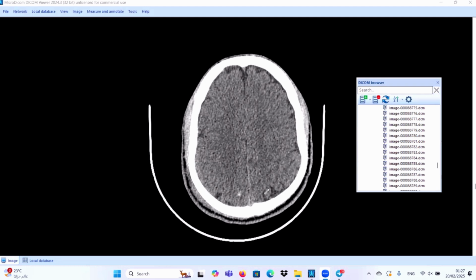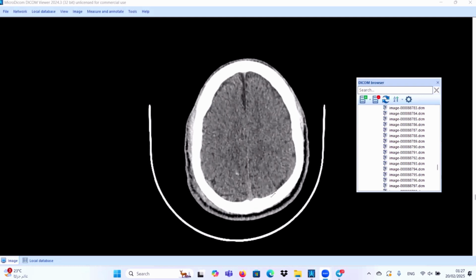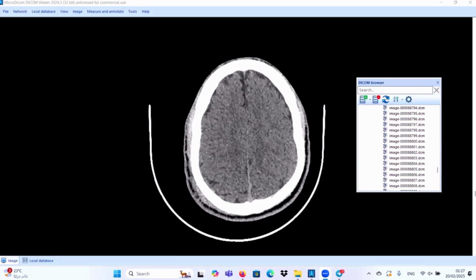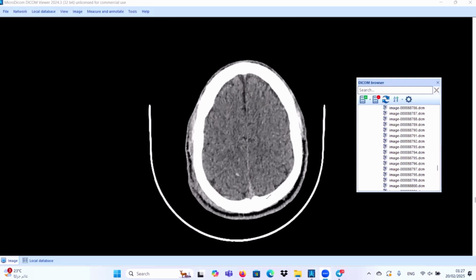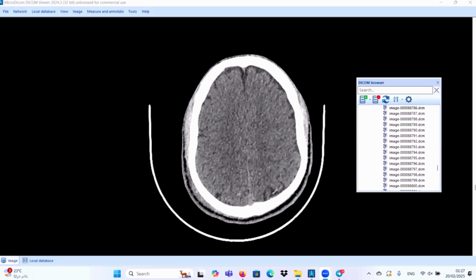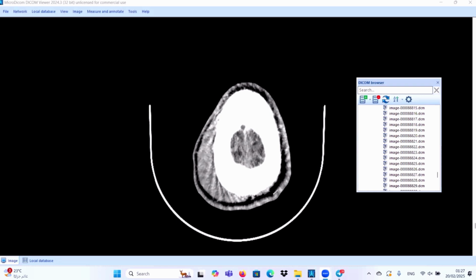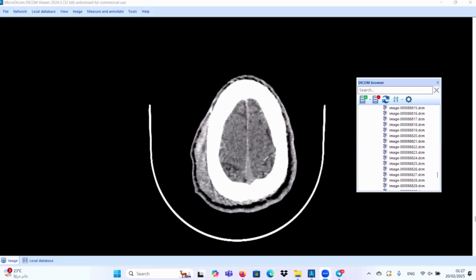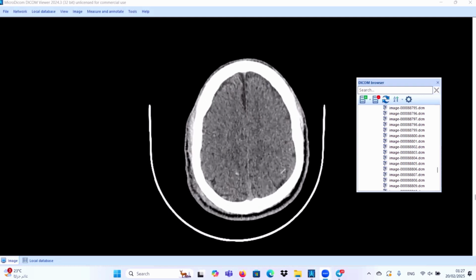The differential diagnosis for these areas may be cerebral contusion, hemorrhagic brain metastasis, as in the case of melanoma metastasis, for example, and also multiple cavernomas. But in our logical thinking, once we have a trauma patient and a large subgaleal hematoma, we have great force, and this can be manifested by this petechial hemorrhage at the subcortical region.